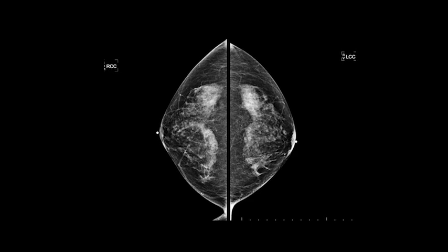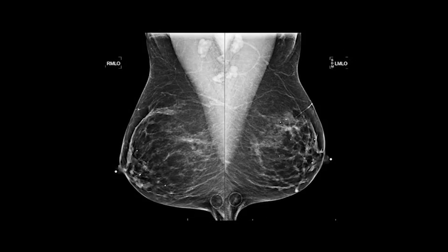And these are an example of good images to send. No, we don't see muscle, but as long as your posterior nipple line measurements meet a requirement on the MLO, these would be a good set to send in for accreditation.